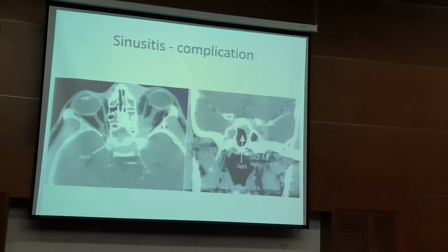Compare left and right. And here you can see, it's bulging out. So meaning, there's something within. Something within can be due to thrombus or it can be due to CCF. In thrombus, you will see a filling defect. In CCF, which is carotid-cavernous fistula, you will not see a filling defect. So this is sinusitis with complication, which is cavernous sinus thrombosis.